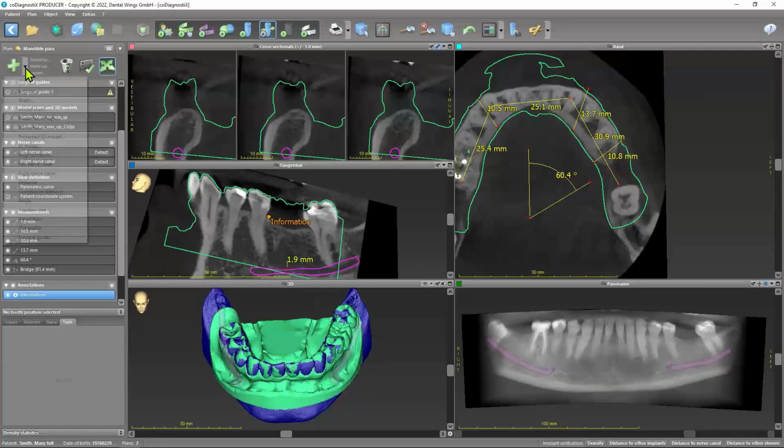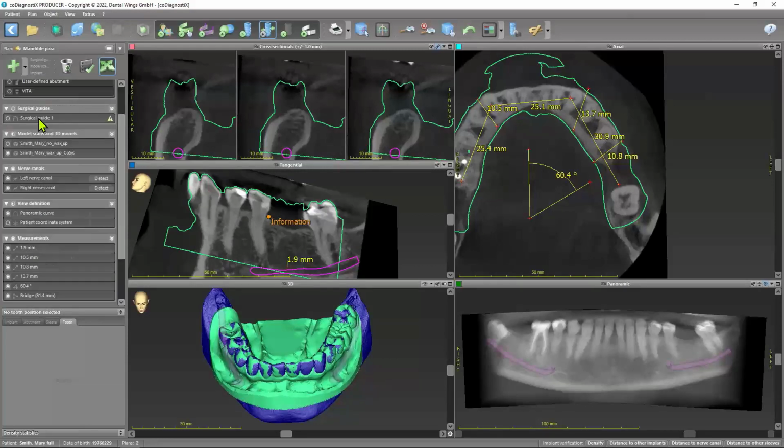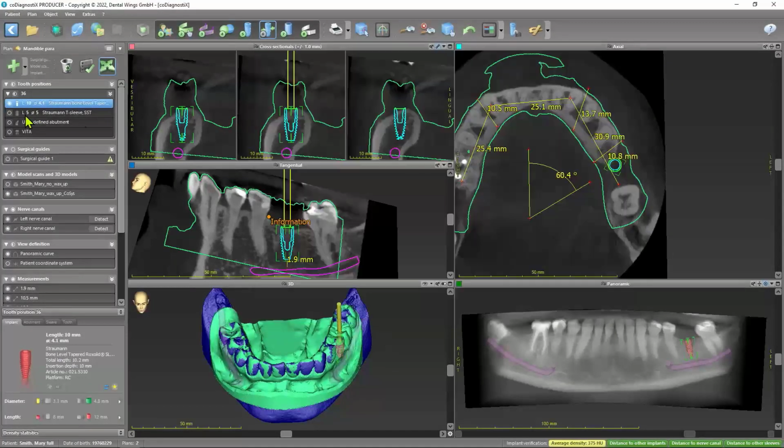I think I'm done with most of the functions. Here we are on the surgical guide, everything on the left side. We have to activate everything here. Display object, this is the information, because here I'm on information. If you go, for example, on the implant and let it see here, you see what kind of implant you had. So you can design a lot of things here.